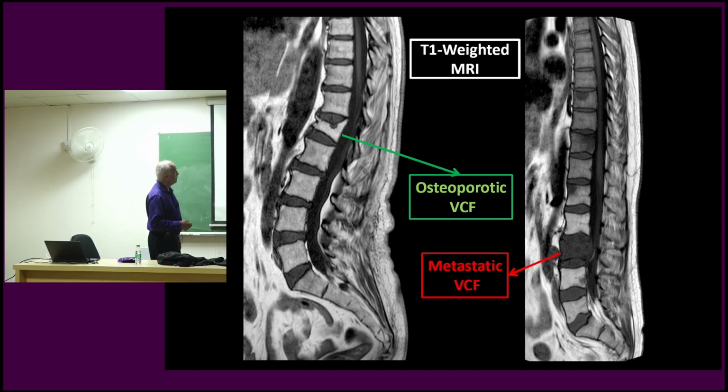So here are, that clearly is not me, I'm not doing that. So here is a case of the fracture. The others are almost like squares. And here there is a concavity and the shape is totally out compared to the others. So that is osteoporotic. Metastatic is different.